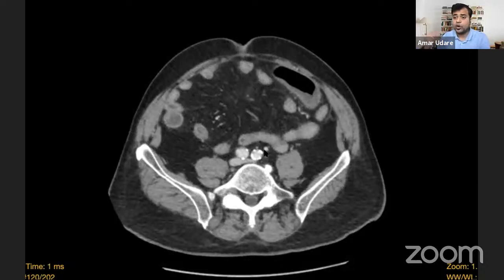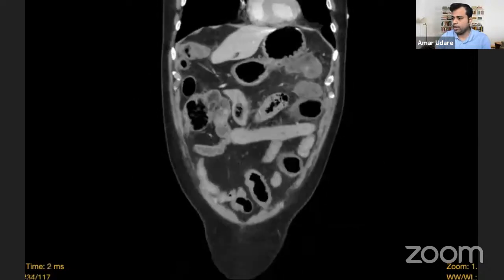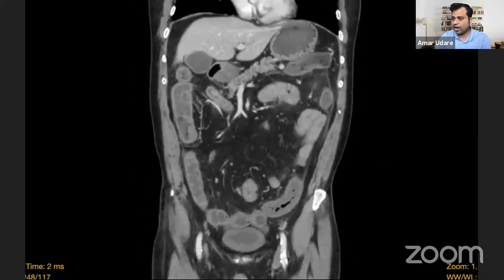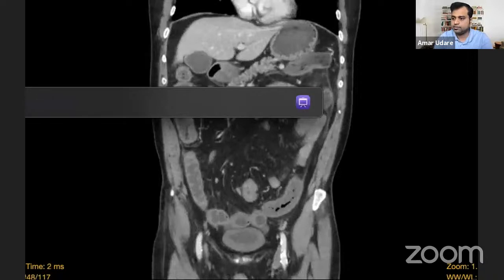So excellent, Zelda, you've rightly pointed out. Whenever there are, say, low cardiac output states or any cause that can cause mesenteric vasospasm, that can give rise to non-occlusive mesenteric ischemia. And this is a very particular location for that because of this being a watershed territory. So let's look at the coronal. This portion of the bowel in the, say, right half, let me start annotations.